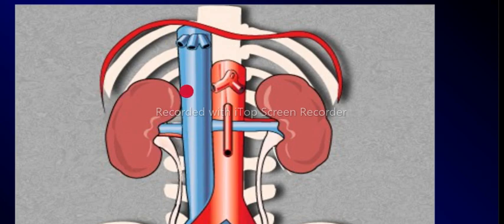Those are the ureters. Now, on routine ultrasound, the ureters are not imaged. Because they're not imaged, we won't be talking about them unless they are filled with fluid, in which case the fluid helps to outline them and we are able to see them. So we won't be talking about the normal ureters, except when we have hydroureters. That is when they are filled with urine and a bit easier to see.